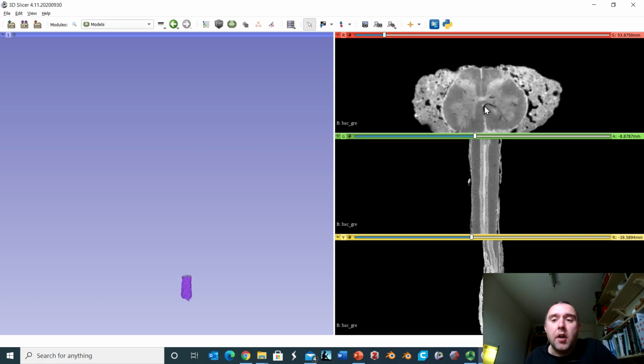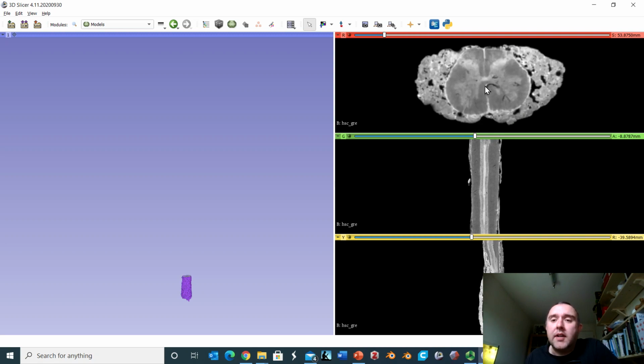So here we are in the lumbar enlargement, and we can see now that the absolute amount of white matter has started to decrease, but we've got big regions of grey matter here corresponding to motor and sensory neurons, which are distributing out through the lumbosacral plexus. And furthermore, we can see that the cauda equina is forming nicely surrounding this lumbar enlargement.